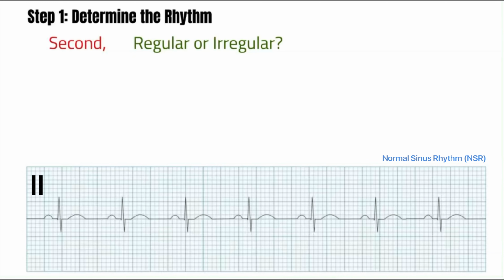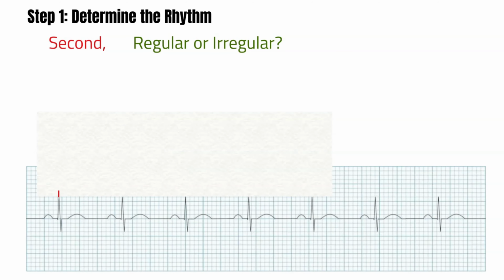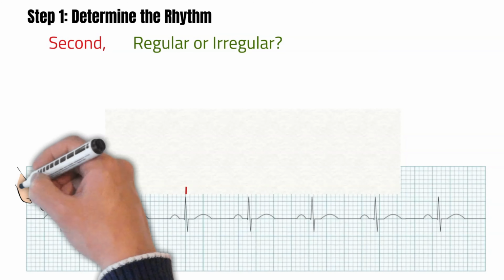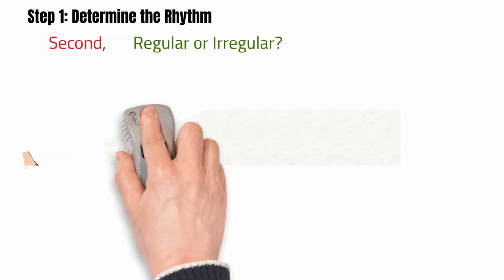This is lead 2 of the ECG. To assess the cardiac rhythm accurately, a prolonged recording from one lead is used to provide a rhythm strip. Lead 2 usually gives us a good view of the P wave, and lead 2 is commonly used to record the rhythm strip. As you can see, the RR intervals are consistent, the P wave is present and followed by a QRS complex. Therefore, this ECG is regular sinus rhythm.